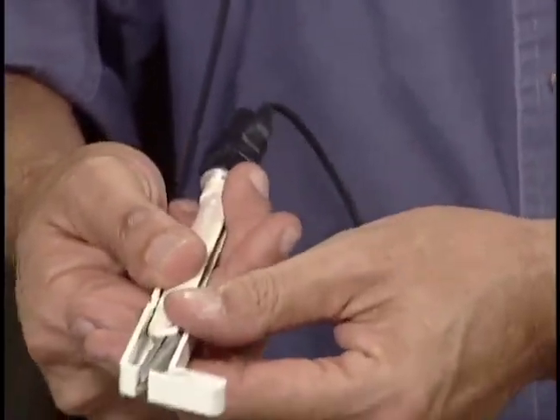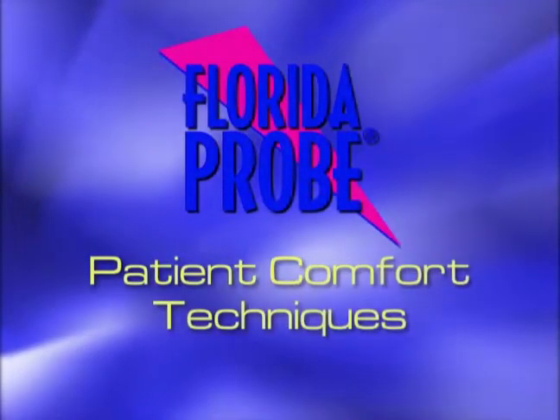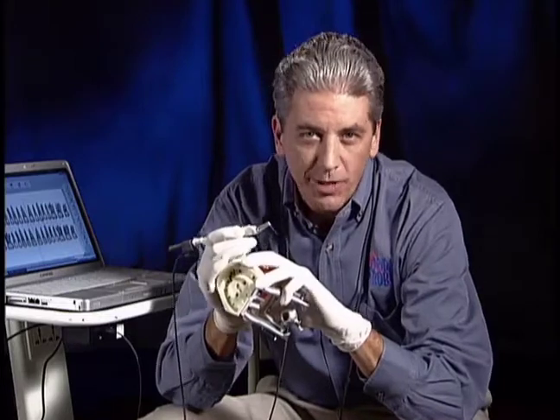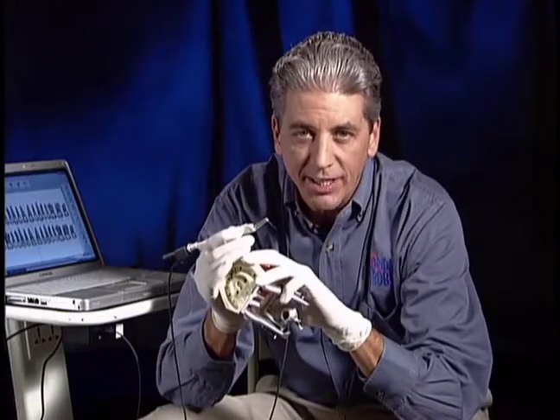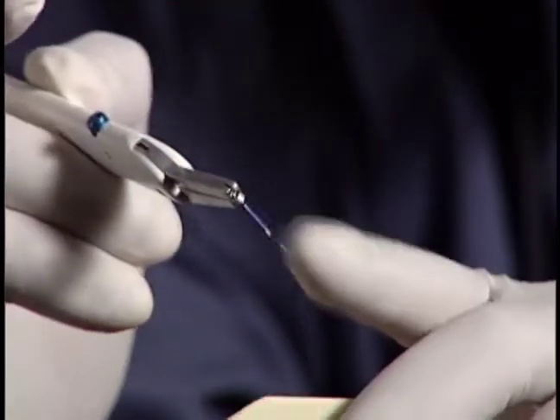Take off the protective cover, it just clicks off. Now the first thing that I do is take that handpiece and push it against my glove finger. I want to check that the tip is free floating. There are 3 issues relative to patient comfort that are somewhat technique sensitive. The first one is a bent or kinked tip.